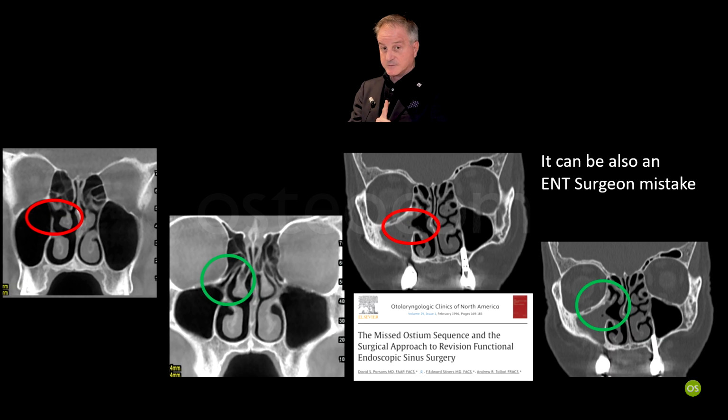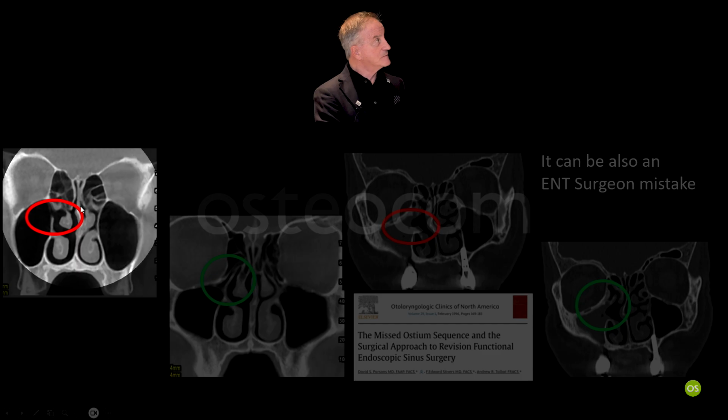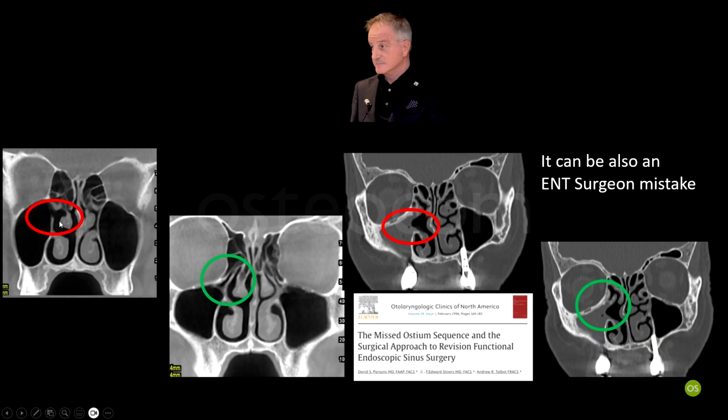It's very important to check. It's only one factor that you have to look when you see a CAT scan. I see this opening, I know immediately that is not the sinus opening.